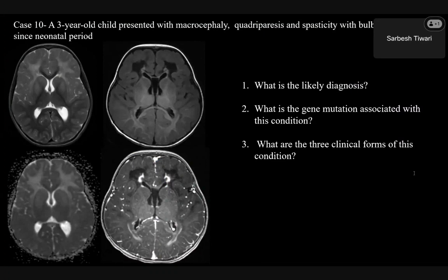Extensive white matter changes with frontal dominance, which was there in our case. A periventricular rim with high signal intensity on T1 image. I showed you the periventricular rim. Low signal on T2 weighted image. The same rim, which is hyperintense on T1, appears hypointense on T2. Alright. Then abnormalities of the basal ganglia and the thalamus.